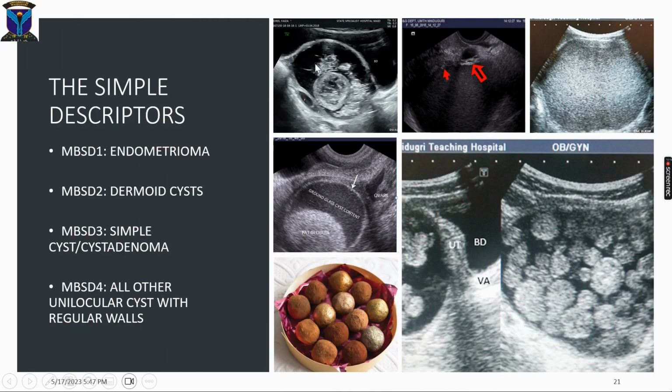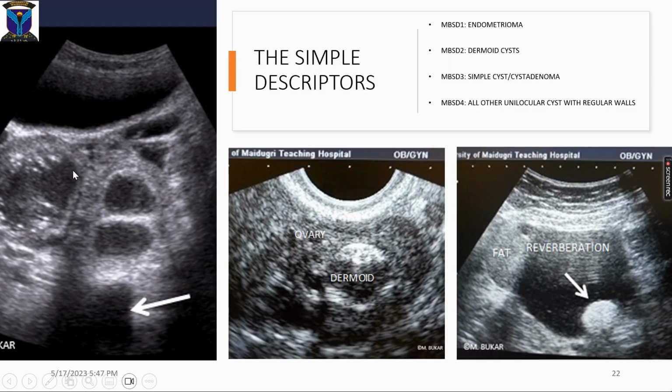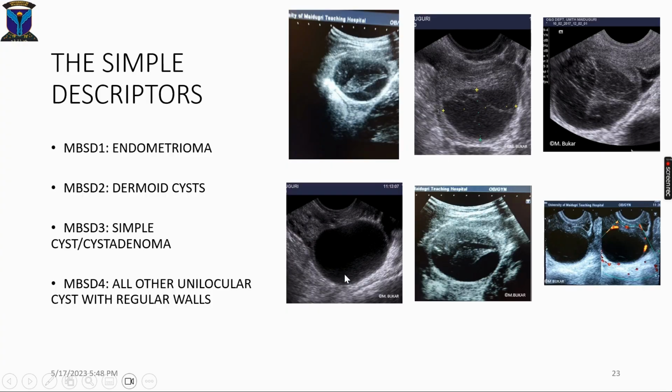In the case of dermoid, you can see here a mesh in fat. Here you can see the typical ground glass appearance of the dermoid. And here look at this pathognomonic feature of mature cystic teratoma, what others describe as chocolate truffles. Again here, this is a case of multilocular dermoid with Rokitansky nodule, and this is intralesional dermoid, which cannot be picked up by laparoscopy.